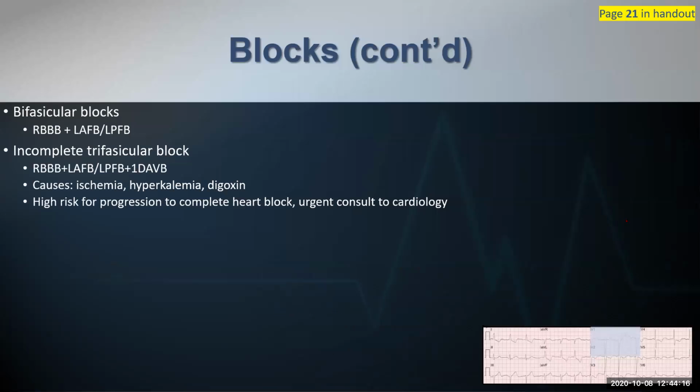So yeah, this is a left anterior fascicular block. Great job, Gracie. So bifascicular blocks are when you can have a right bundle branch with either a left anterior or left posterior. If you have a right bundle branch with which one of those would be concerning for a complete occlusion? Anyone? Right bundle branch with what, not circumflex, which block? Yeah, so with the left anterior fascicular block, it is suggestive of complete occlusion at LAD.